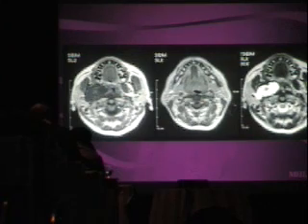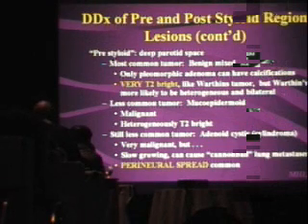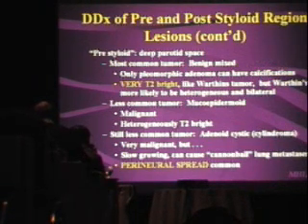So you want to make sure you completely take it out. Okay? What else is in that differential diagnosis of T2 bright parotid lesions? Well, it could just be lymph nodes. A single lymph node isn't going to be that big and irregular. If it's multiple and bilateral, in addition to lymph nodes, it could potentially be what's called a Warthin's tumor. That's probably the one thing you could leave in.